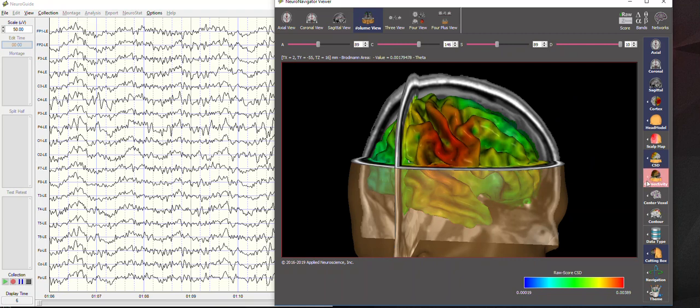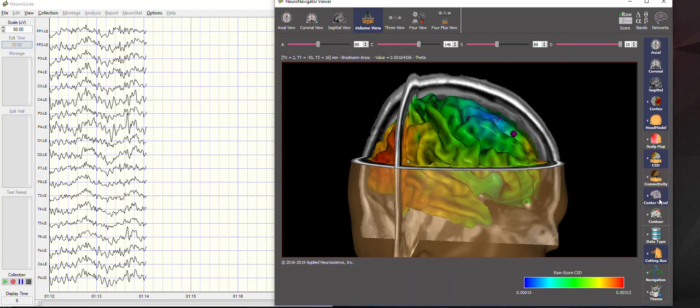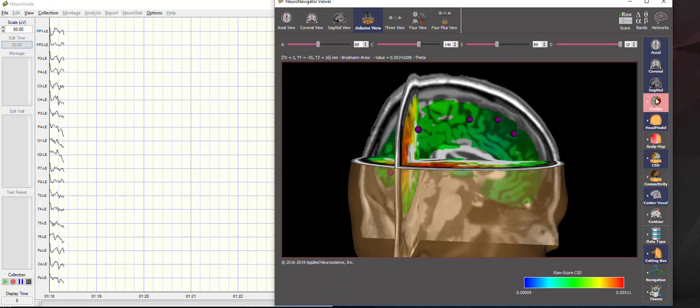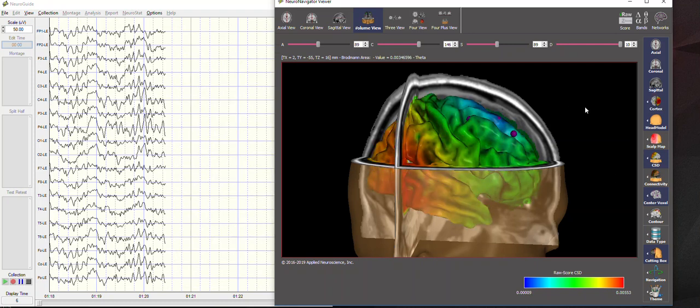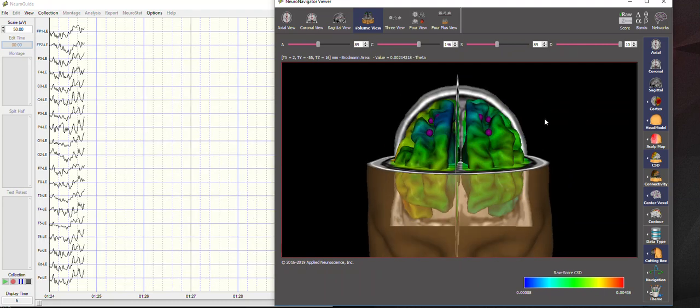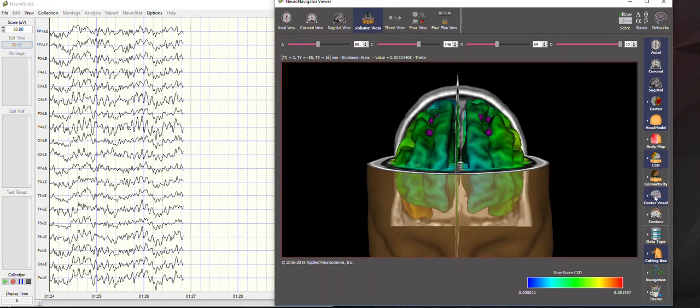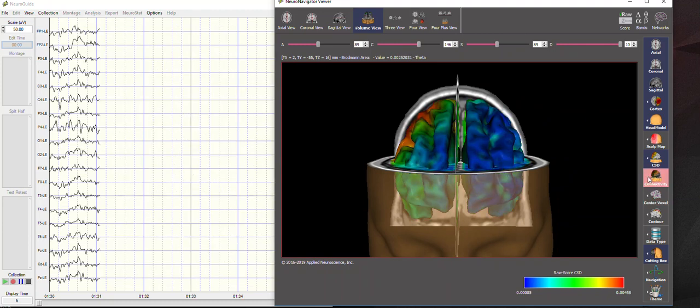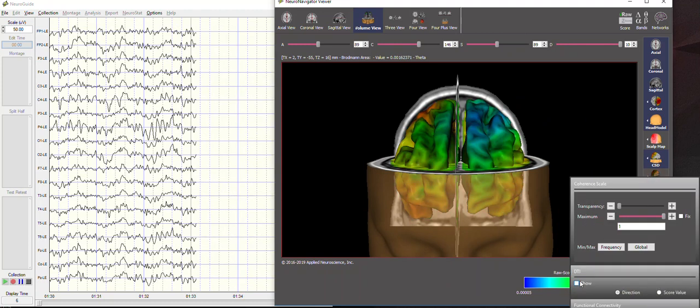We can also look at connectivity. For now, we can look at the center voxels, which are from the Brodmann areas of the center voxels. And in the future, we'll have the connections to those center voxels with the different networks. I'm going to remove the center voxels for now. We do have diffusion tensor imaging. I'm going to show you that.